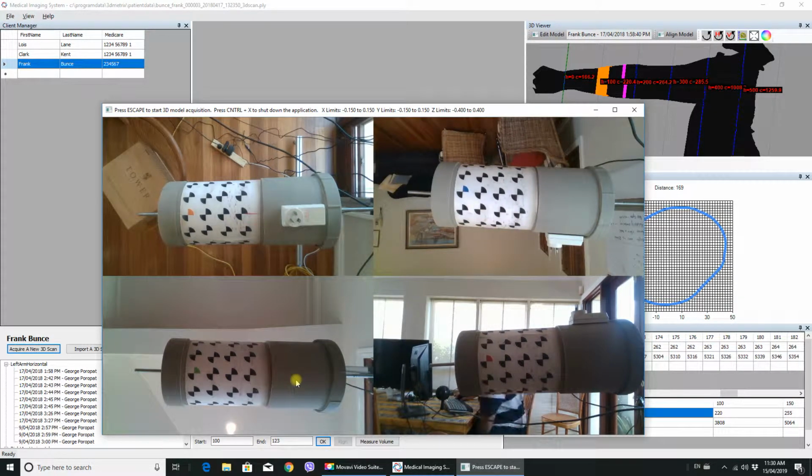Now, you'll notice that each one of these faces, red, blue, orange, and green, is marked by a series of spots. These are the calibration markers, and in fact, the device that's in the system at the moment is the calibration cylinder. It's somewhat different because it's got on top of it a double adapter. I put that there to show the effectiveness of this, which is the circumference measuring device at a later date. So I'm happy with that.